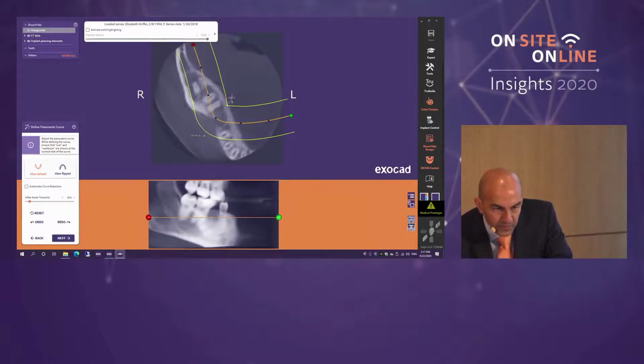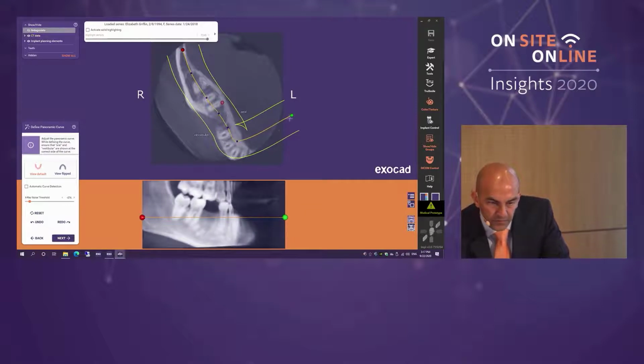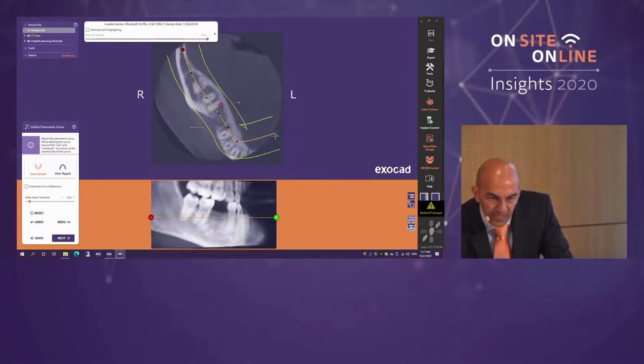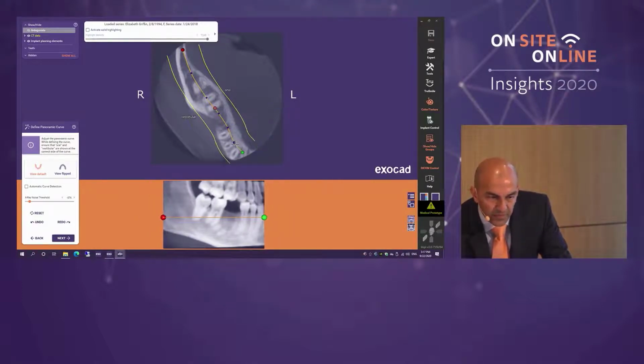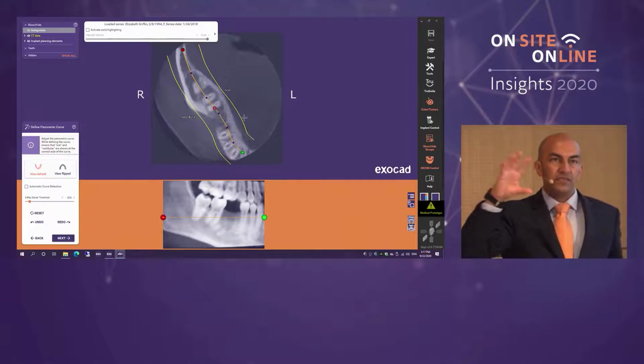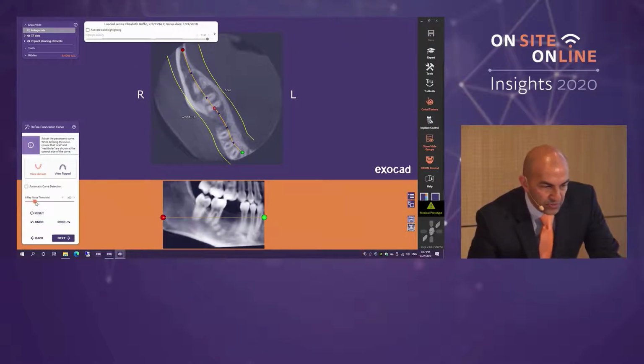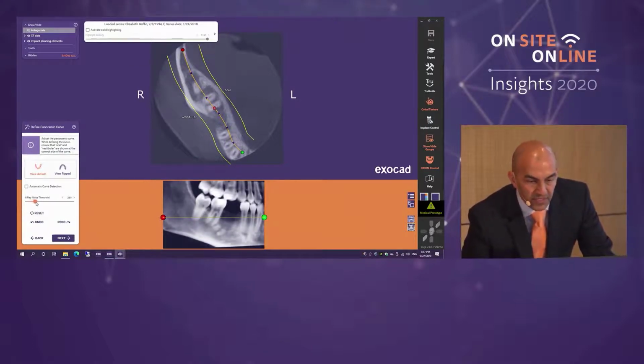Now, next thing we're going to do is use these control points in the top jaw, and we're going to start drawing a line through the middle of the proposed arch form. So we're basically creating a modified field of view, okay? And you can see what's happened in this particular case is now we can see the sectional panoramic data in the lower jaw. On the left-hand side, I have a noise threshold for my X-ray, so you can really see the X-ray clearly.